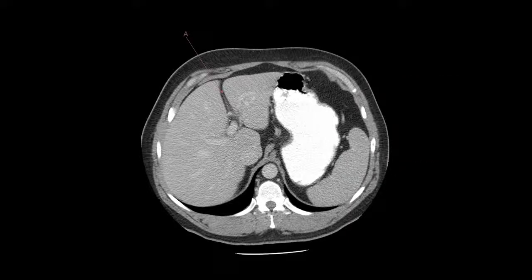Alright, what are we looking at A? So you've noticed that the liver has divided now, so we actually are seeing some lobes to some degree, right? So, and this is right between these two lobes. So you have the round ligament of the liver.